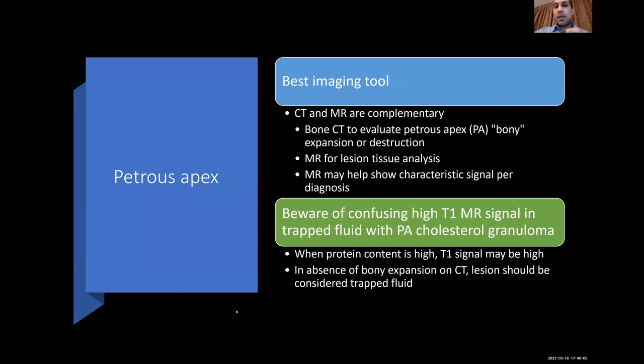What is the signal in fat suppression sequences? Okay. What else? Okay. This is a high signal. The signal will not suppress because it has a more hemorrhagic component. Okay.